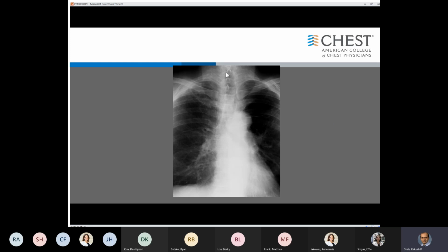is very limited, but it is always important for us in the pulmonary world to always inspect the airway. If you get into the habit, then every now and then you will see that here's the trachea, and here's the right main bronchus, and then left, but you can see that there is a filling defect in the distal trachea extending into the left main stem bronchus. Not the prettiest image, but you can kind of make it out.